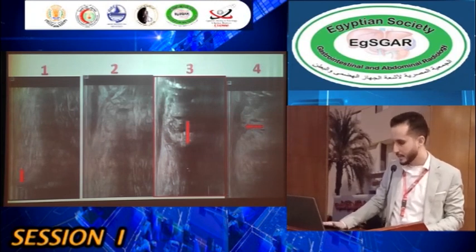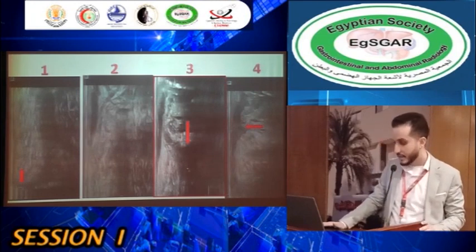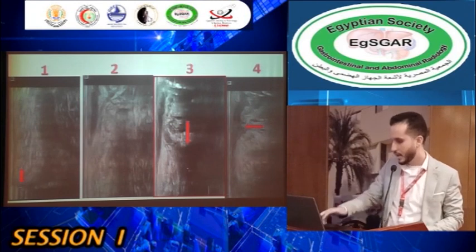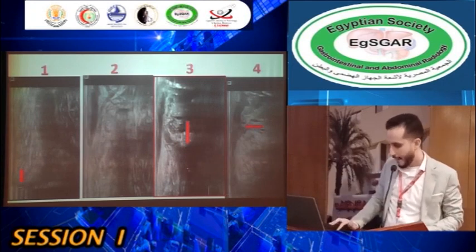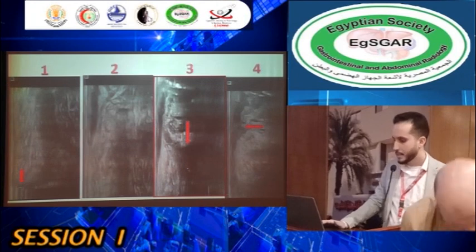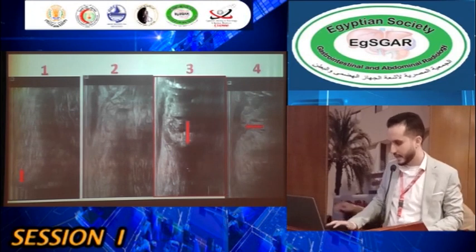along the subcutaneous anal space. In image number 2, we can still see the hypoechoic tract extending upward, and the internal anal sphincter starts to appear, this hypoechoic structure. Then in photo number 3, we found that there is a hypoechoic collection with two branching tracts, secondary tracts.